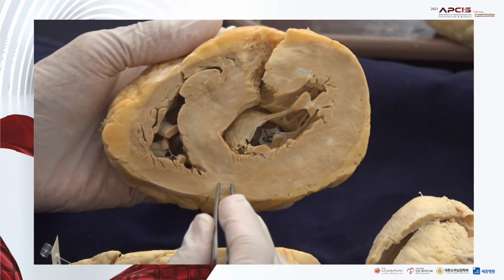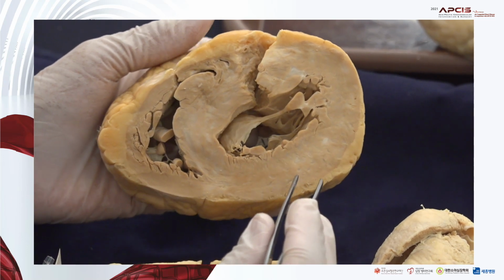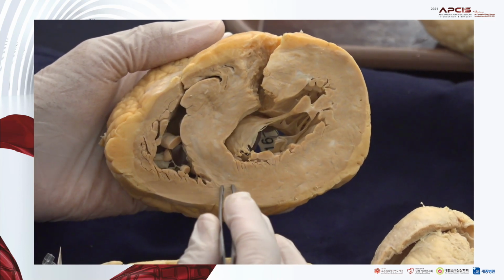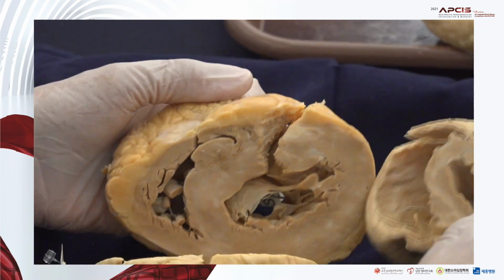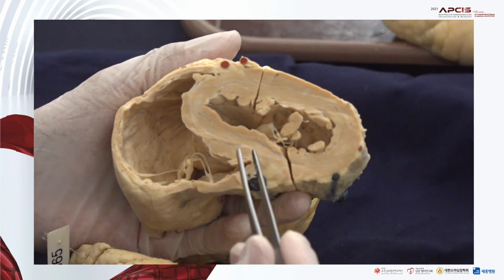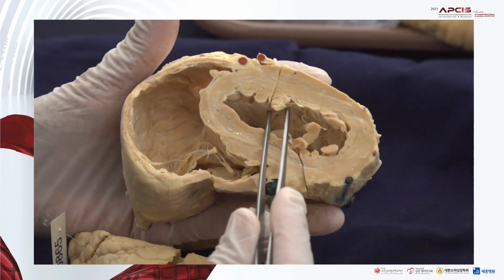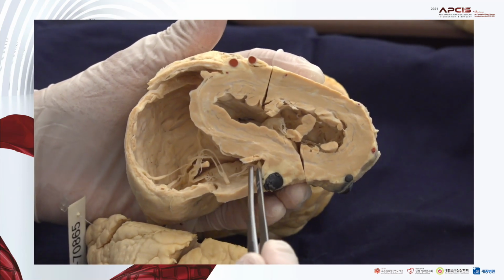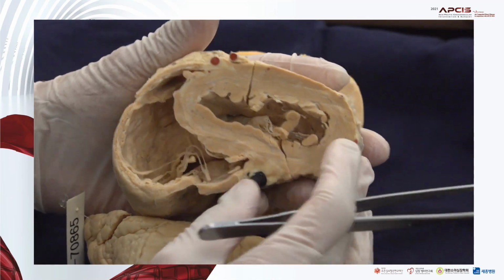But if you examine a transplanted heart microscopically, it's really difficult to recognize any granuloma in these cases because they have been treated for so long. Every sarcoidotic granuloma has already disappeared, and the remaining fibrous scar is the only clue. I have studied several cases of sarcoidosis, and many of them were diagnosed a long time before transplantation, so I could follow the progress of granulomatous lesions detected from the right ventricular endomyocardial biopsy. At that time there was granuloma in the past, but now, after transplantation, it is almost absent. That is a characteristic feature of sarcoidosis.